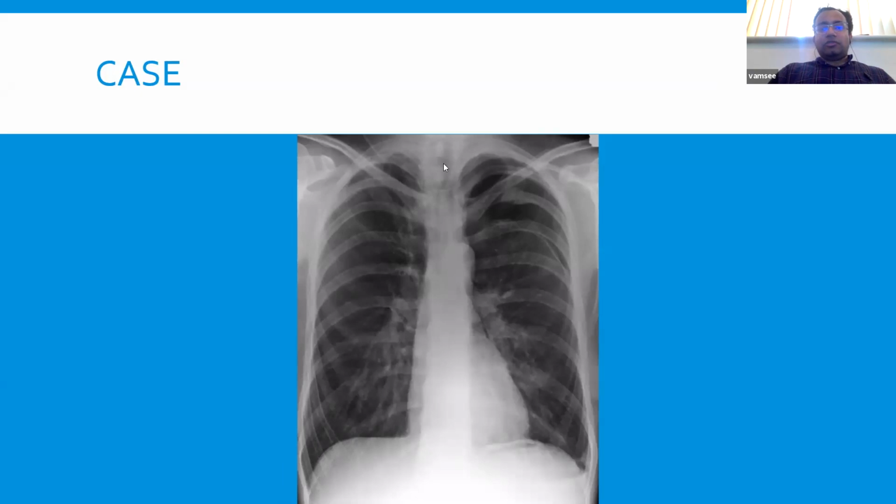So one of the things to look out for, yes, there is a fracture. Well done, Azar. Yes, there is a rib fracture. Which side? Yes, indeed. So you've got a left rib fracture there. Now we've almost got there. What else can you notice surrounding? Exactly. Yeah, so I agree. It's a pneumothorax along there.